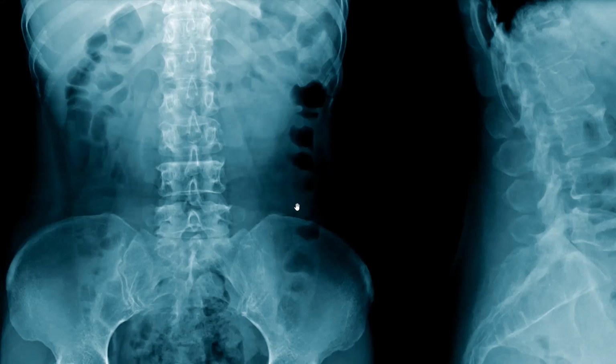This patient. If you look here at the colon, see air here. Here you can see this is the bowel wall. It's thin. It's like a millimeter, a couple millimeters in thickness. You can see it laterally. Okay. This density right here represents the outer margin of the bowel wall.